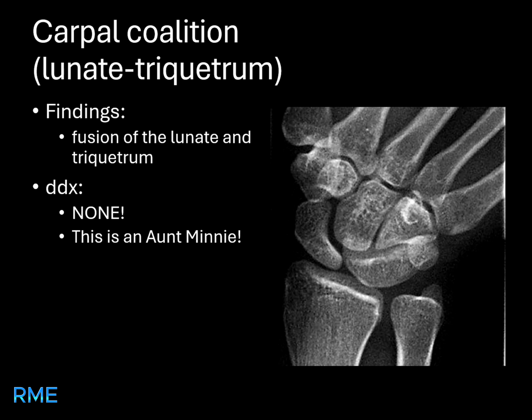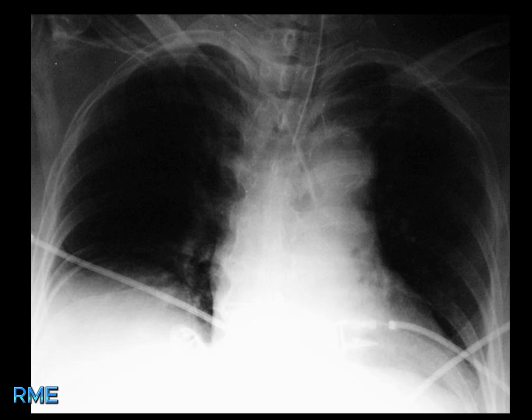There are no differential diagnoses here. It's an Aunt Minnie. No further investigation is necessary as this is a known congenital anomaly. Management is usually conservative unless symptomatic, in which case surgical options may be considered. Let's move to the next case.